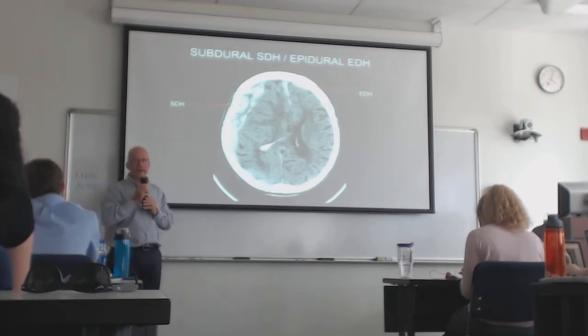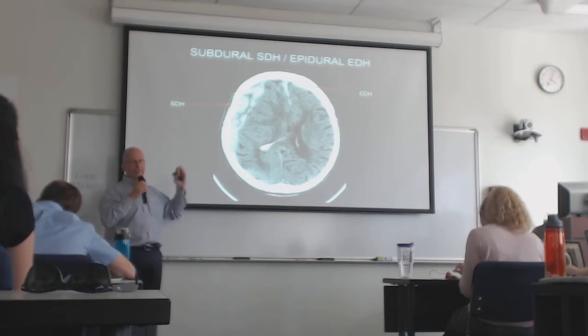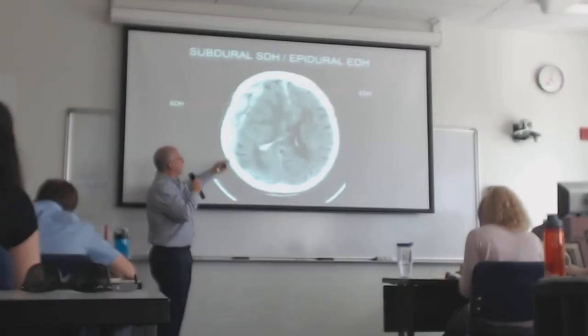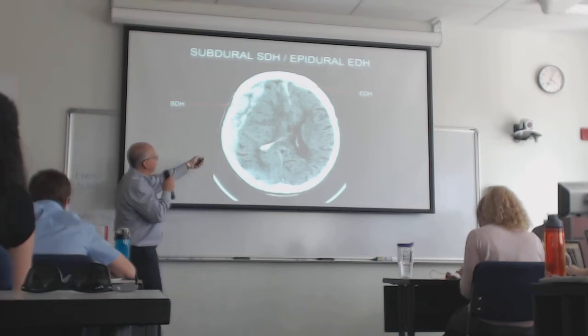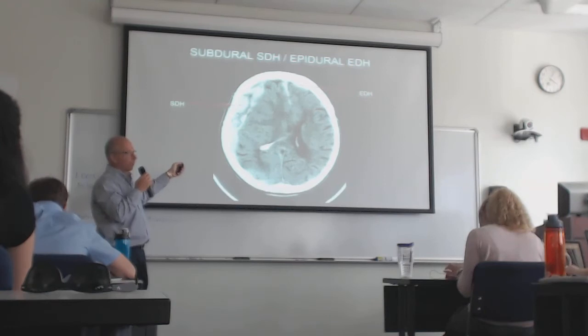Radiologists will refer to the intraaxial portion of the brain as the brain parenchyma and ventricles, and extraaxial brain as the epidural space and the subdural space. So this is a hemorrhage which has got a lot of whiteness in it. It's also got some dark stuff in it. This one may not be super acute. It's maybe several days old, where it's starting to resorb.